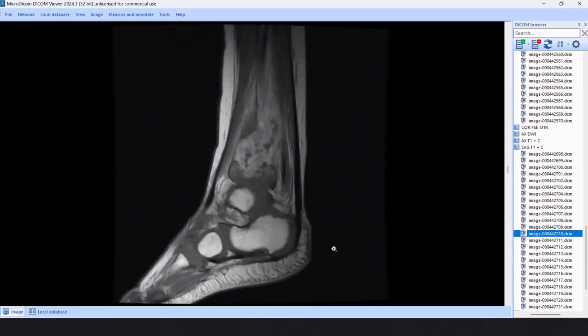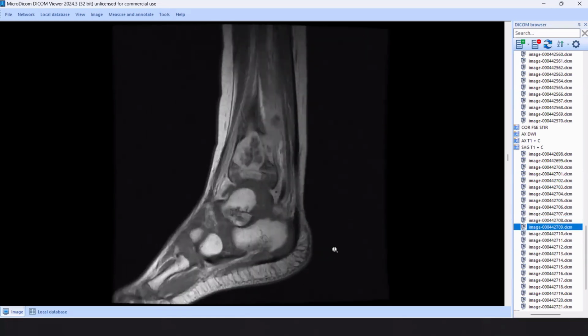So really, when I saw this case, it's a progressed case. In spite of medical treatment, the lesion is progressed. At the same time, I have a metaphyseal lesion with epiphyseal extension tunneling into the epiphysis, one of the most characteristic signs for Brodie's abscess. Also, we have the penumbra sign, high T1 signal along the margin. Also, we have the complication of early septic arthritis of the ankle joint. All of these criteria are matching with Brodie's abscess and osteomyelitis.